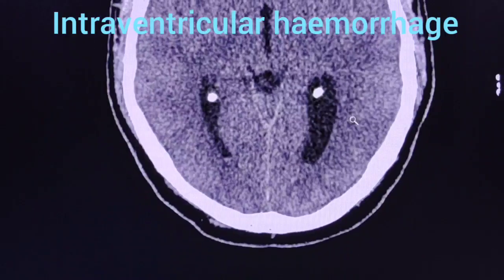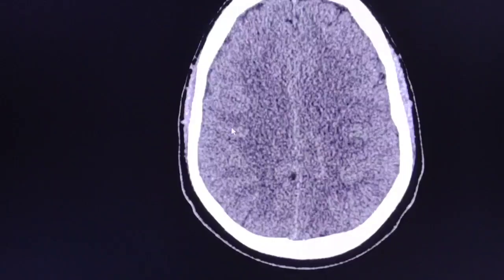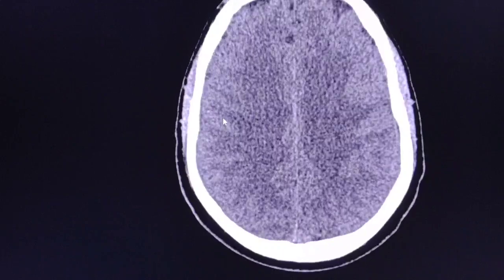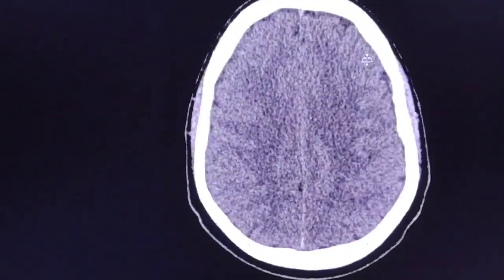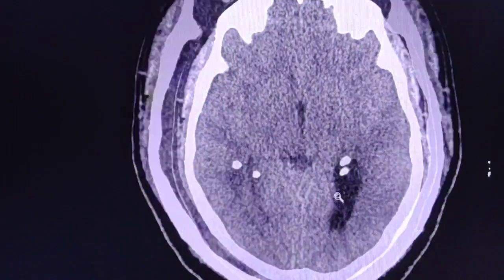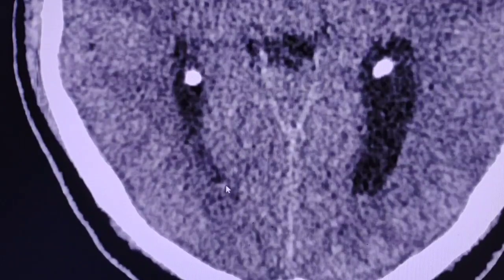It is very difficult to see the sulcal hyperdensities. However, the peripheral subarachnoid space cannot be optimally evaluated in this CT scan. Okay, now let's go to the finding again, because it's very important. Here and here, these small hyperdensities.